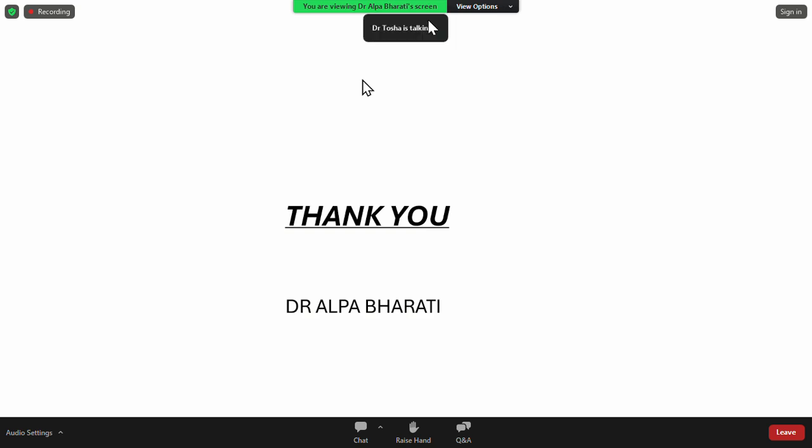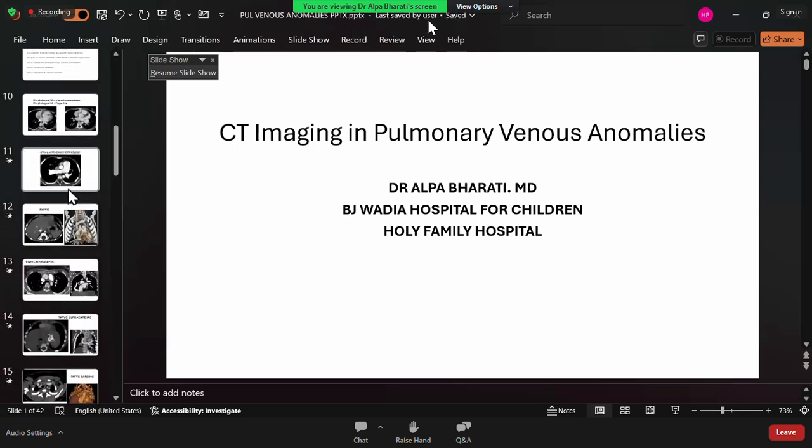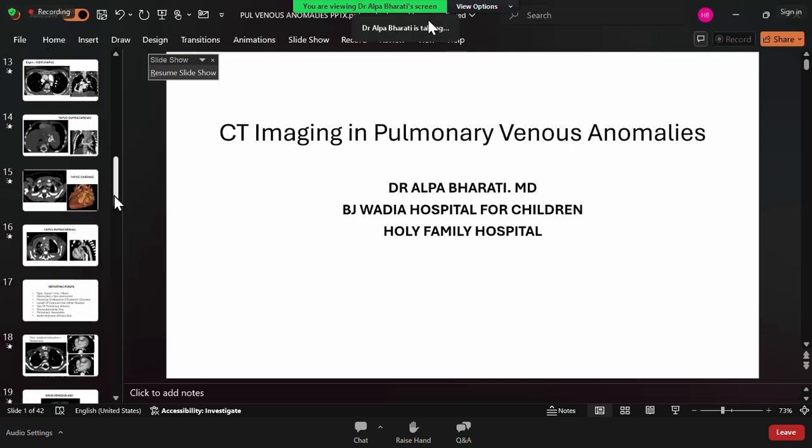Thank you. Ma'am, can you please explain sinus venosus ASD again? Okay, so sinus venosus ASD is basically an atrial septal defect with a pulmonary vein draining across the atrial septal defect. Should we go back to the case which we had shown? We'll go back to the case and see it again. Am I sharing the screen already? Yes. Okay, good.